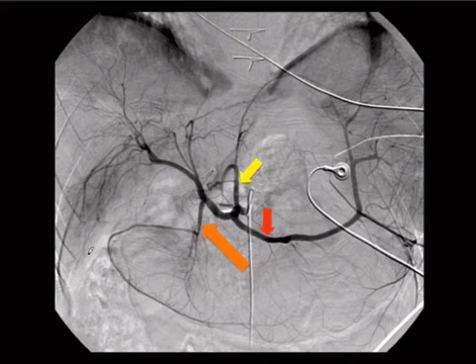So first thing to figure out anytime you see one of these things is where the hell is the catheter parked? So you've got basically three choices when you're dealing with mesenteric stuff. You're either in the celiac, you're in the SMA, or on a rare occasion you're in the IMA. If you have no idea, I would guess celiac first. If celiac's not a choice, then I would guess SMA. I would pick IMA last, just because the questions for an IMA injection are going to be hard, and it's just less common.